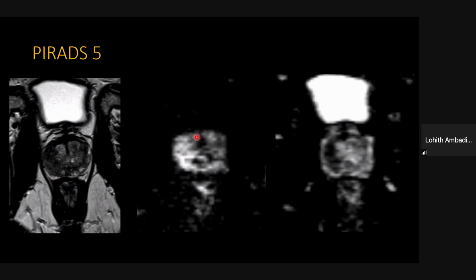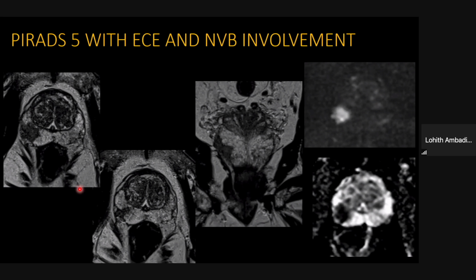So that's another PI-RADS 5 lesion. And there is the prostatic capsule, which looks quite smooth and intact. So for the neurovascular bundle, I don't think there is any extracapsular extension if the capsule looks intact. Now, let's see another case where T2 weighted imaging shows a bright peripheral zone.